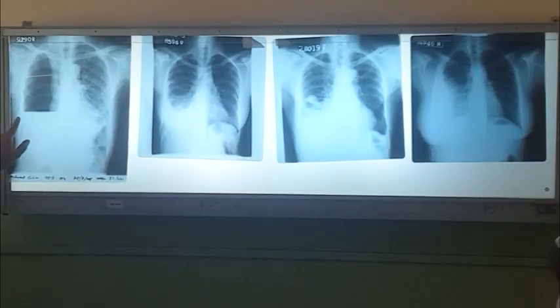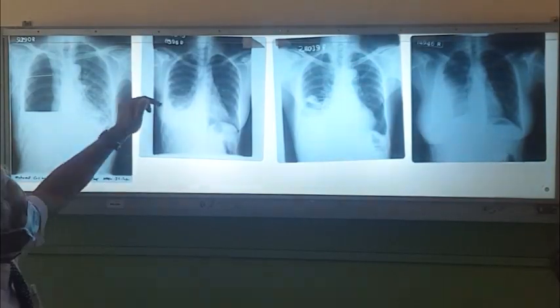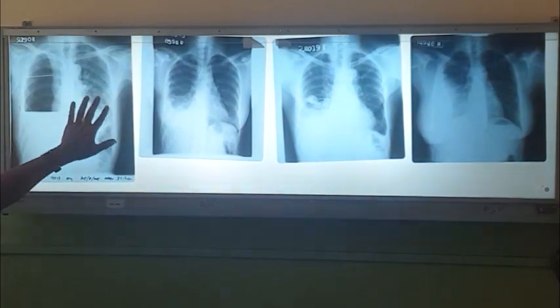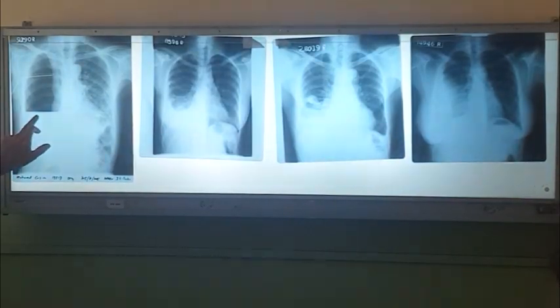So here you have a fluid line. If you see a straight line there, there should always be air above that. A normal pleural effusion will be like this, concavity moving round, right? So if you see a line there, always think of air above that, that is hydropneumothorax, right? So this patient is a TB patient. He has on the left side a lot of cystic changes, inflammatory shadows, acute TB changes, with right-sided hydropneumothorax. This is the collapsed lung. In addition to that, this is an ICD. You can see a small line of air outside the chest wall, so that is surgical emphysema, right?